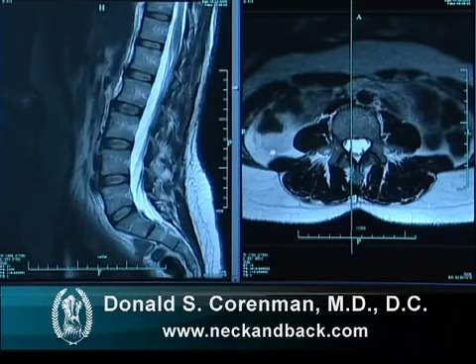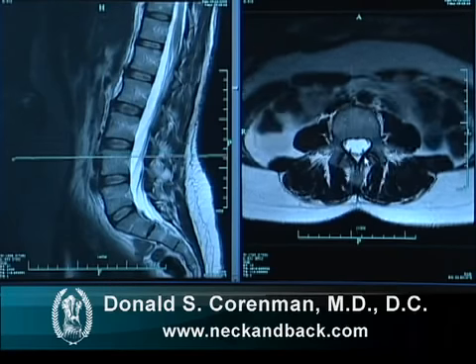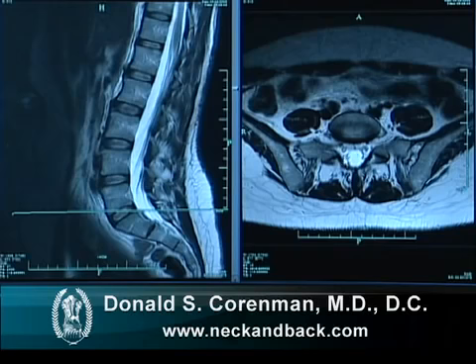If we then go to the top-down view here, we can look at the angulation and cut of the spine and visualize the spine as what it would look like if you took a samurai sword and looked up at the spine from there. We're going to start at the L5-S1 disc. At this view, this is the dural sac, the sac of nerves. All these black dots within this white sea of water are the nerve roots, and these are the nerves that have already exited out of this sac. These nerves exit like branches on a tree.